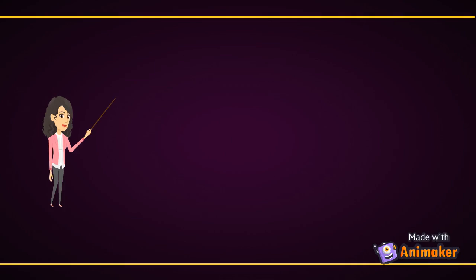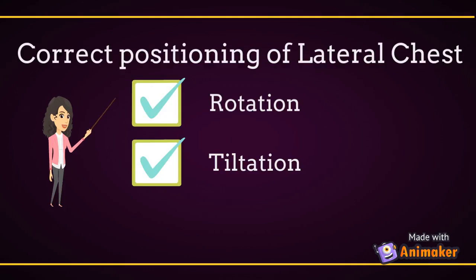Okay everyone, let's recap on what we have learned so far. We have covered the rotation and tilt elements in the evaluation of positioning accuracy in lateral projection of chest.